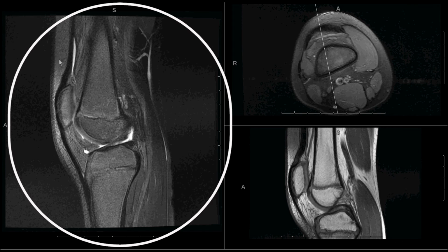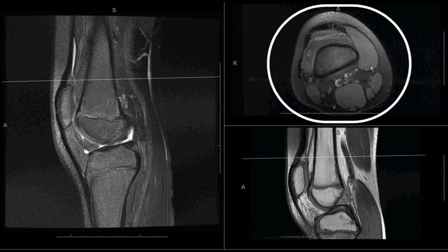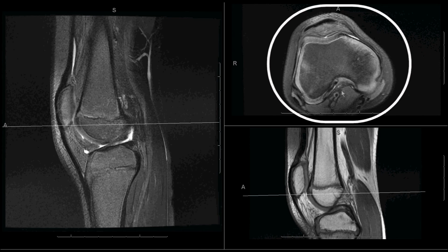Of the soft tissues finally surrounding the knee, one wants to comment on edema in the skin of the knee, the subcutaneous fat, and also within the deeper structures. You often get a very good look on the axial image for the same thing, because you'll often see lots of areas of transspatial edema in significant knee injury.